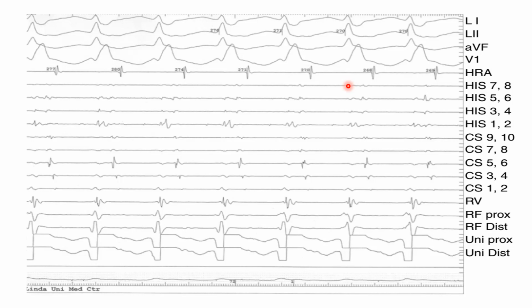Maybe this is the last tracing. We are seeing the surface ECG, and we are seeing the V1 lead dividing the QRS complex, and we are seeing R, this R dash as right bundle branch morphology. So this is the tracing for the right bundle morphology.